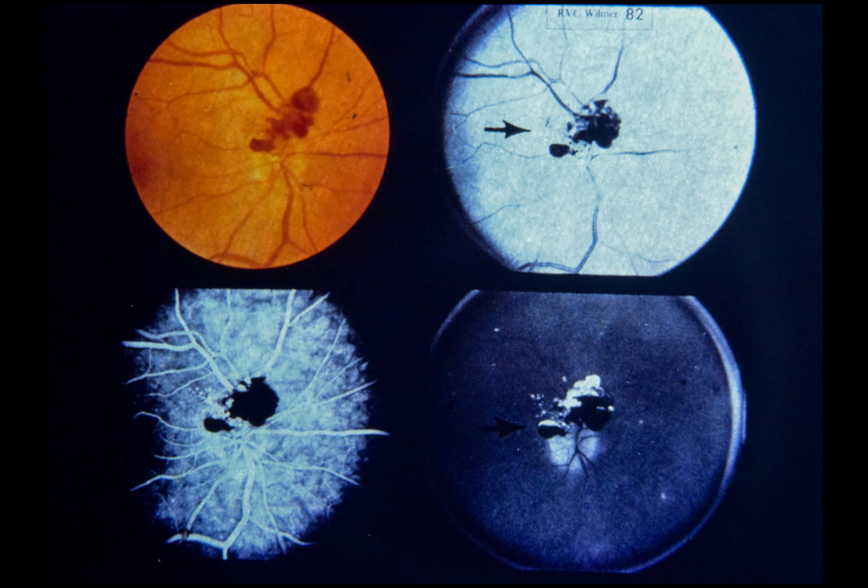Slide 82. Cavernous hemangioma of the optic disc. Cavernous hemangioma of the optic disc and retina is a rare congenital abnormality. Except in the unusual circumstance of macular hemorrhage or vitreous hemorrhage, visual acuity is usually not affected. Typically, aneurysms appearing like clusters of grapes are seen on the surface of the optic disc or in the superficial retina. There may be hemorrhage within the walls of these aneurysms or surrounding them, as seen in the photograph upper left.